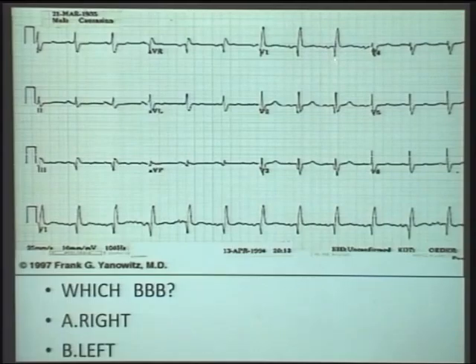You do not have the secondary ST-T change in spite of right bundle branch block, where you expect the ST segment and the T wave to be negative. Here the T wave is positive, which is called homophasic ST-T change. In the presence of a bundle branch block, if your T wave is in the same direction as the QRS, which is called homophasic ST-T change, you must suspect associated CAD, coronary artery disease.